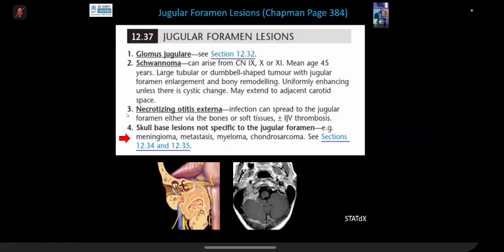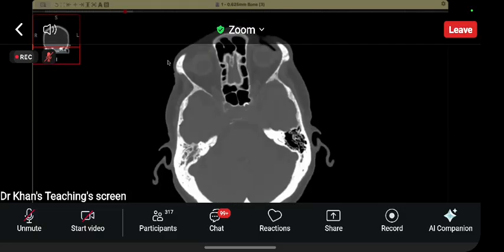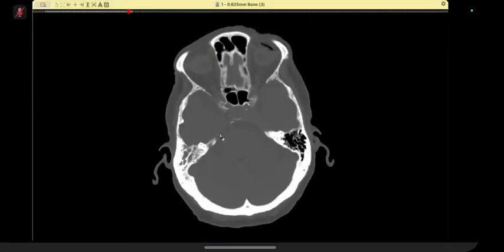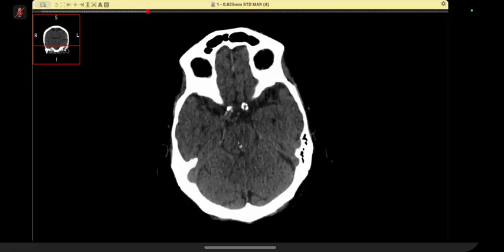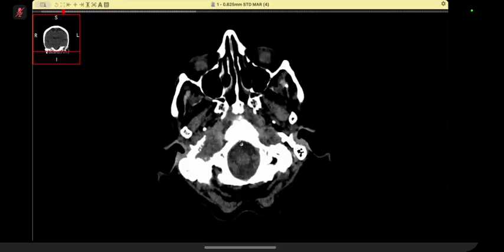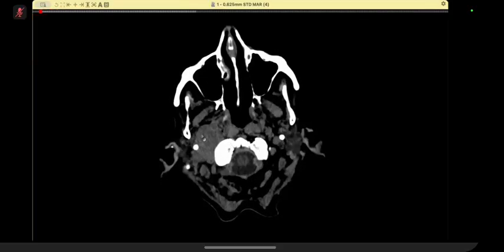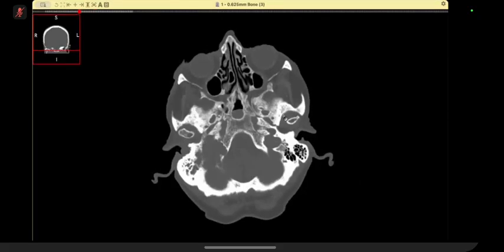Now we go to the key thing here. First of all, a classical exam scenario on a soft tissue window. Please remember today we are doing temporal bone, so your mind knows that it will be something there. But this is a case, and it goes into the carotid space from here. Ask for the bone window, and now see that sign.